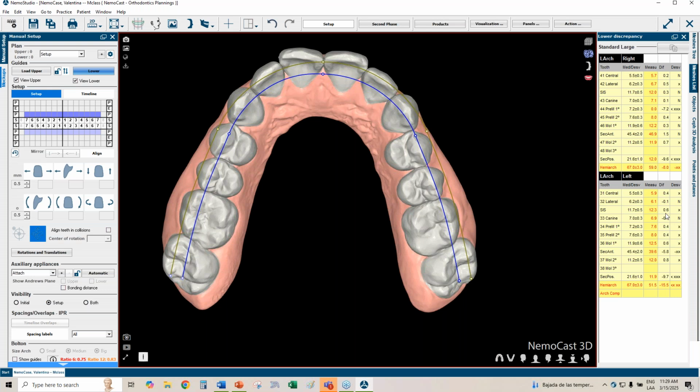And we have 0.6, and now this is not taken very well into account. Okay, so 0.6. This canine is a little bit smaller, but we can add the differences.